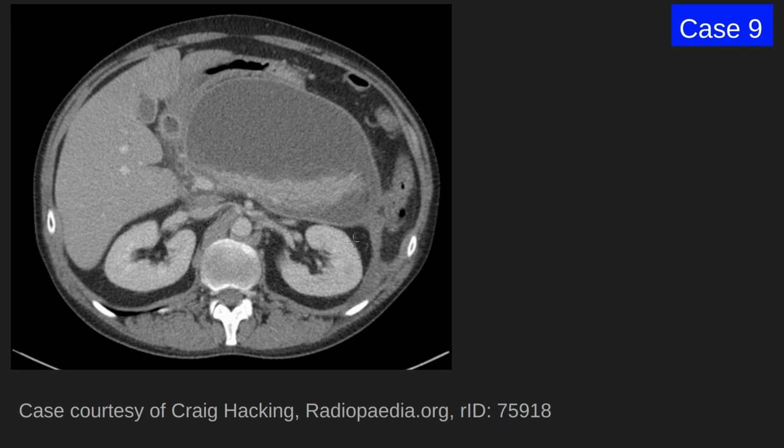So this is a patient who presents with diffuse abdominal pain and has been having difficulty eating anything. When the patient is laying down, the pain gets worse, and this symptomatology has been present for around 4 weeks. Based on the history and the imaging appearance, we'll try to make a diagnosis. This is a CT, axial CT after administration of IV contrast.